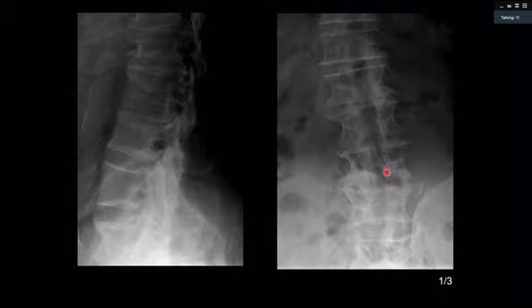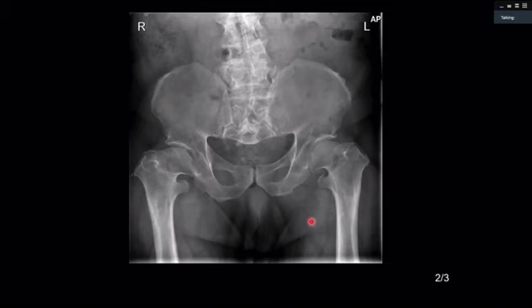Would this be in keeping with achondroplasia? Right. So, same case, anything comes to your mind? By the way, what did you say? I did not hear your conclusion. Did you make a diagnosis? I asked if this would be in keeping with achondroplasia. Oh, yes. Okay, so you've got it.